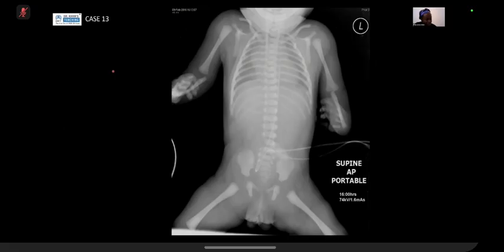What's the correct position? The umbilical venous catheter, which is going to the right, is seen in the portal vein. I think it needs adjustment. It is not in the proper position here. I don't see any. Just before you move on, candidate 3, what are the correct positions for the umbilical arterial catheter and the umbilical venous catheter, for those who don't know in the audience?